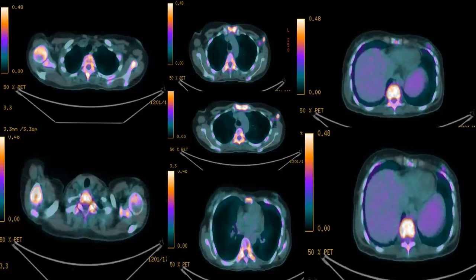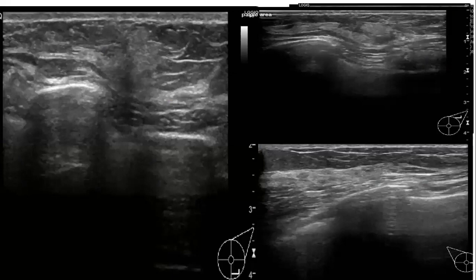This was two years ago, and up to date, I understand that the patient is okay, and she has a good response to the breast cancer treatment. If we go back, this is the same location in the right breast.